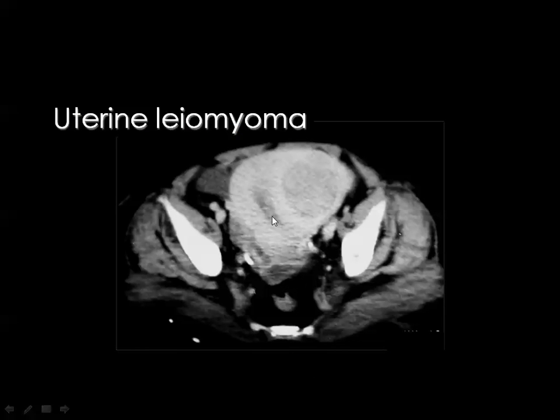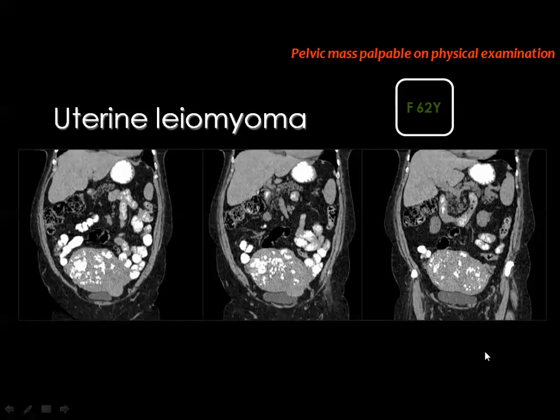And this is the uterine cavity. This is the myometrium, and there is a mass here, and this is uterine fibroid. The fibroid will appear in the CT images of similar CT density and enhancement to the myometrium, but sometimes due to some degenerative changes in the fibroid mass, it will appear somewhat hypodense or less enhancing compared to the myometrium.